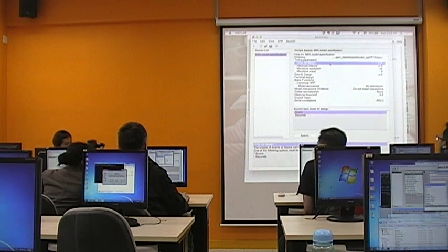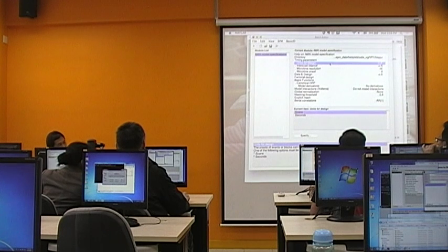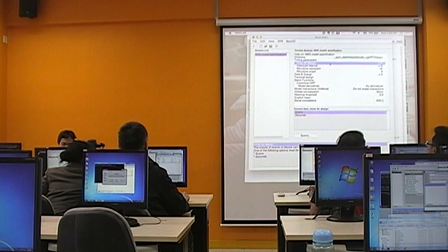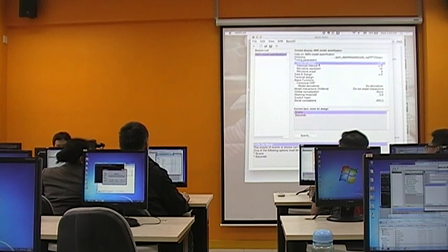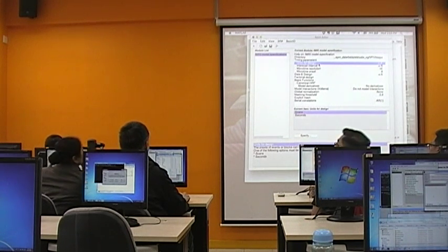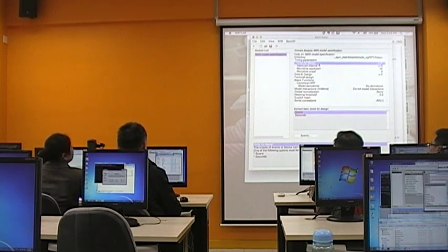In fact, it doesn't matter at all, because no matter how you set it, in scans or in seconds, the final design matrix will be the same. I couldn't recall why there exist 2 different ways of setting it. But anyway, just choose one that you're comfortable working with.